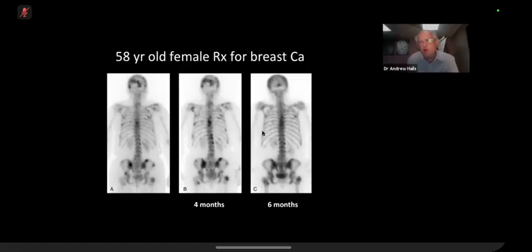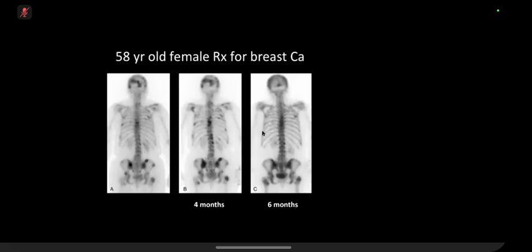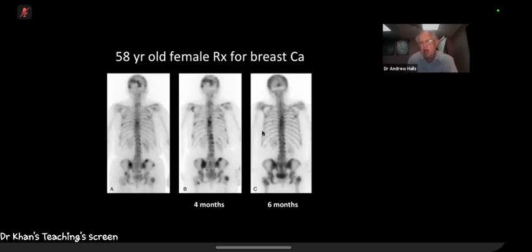Okay. So what would guide you in working out whether this was the disease getting better or worse? I mean, in normal practice, I will correlate with plain films or any cross-sectional imaging that's available. I'm assuming the patient will have 3 monthly CT scans as well, so I could go by the bone density and the bone abnormality in the cross-sectional and plain film just to guide me as well in that circumstance. That's right, yes. You couldn't really fully interpret this on its own, as you're saying, you'd need to have some other imaging as well.